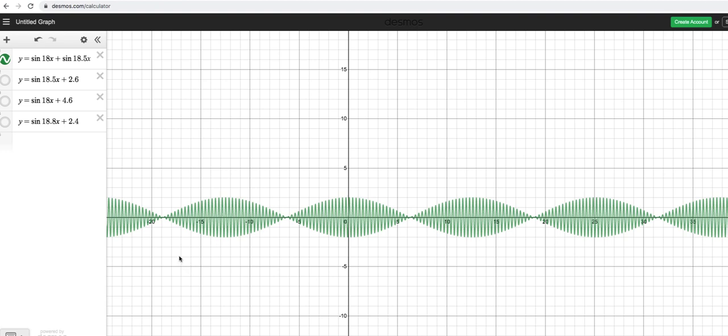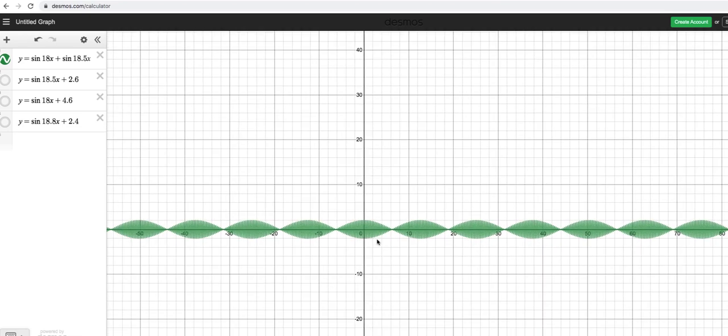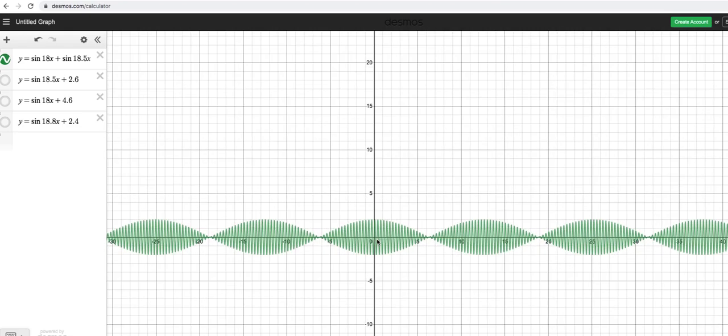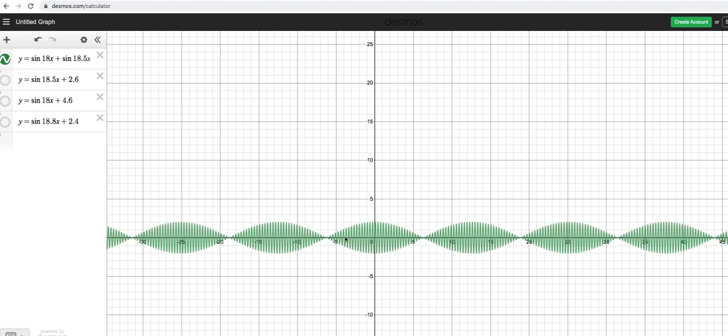You must have seen this kind of pattern on the EEG. Sometimes the alpha rhythm, the posterior dominant alpha rhythm, takes this kind of spindle appearance. I'm just zooming out and zooming in. So you see this kind of pattern sometimes in the posterior dominant alpha rhythm.